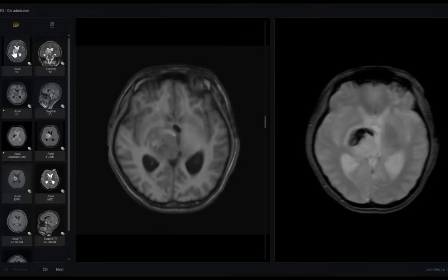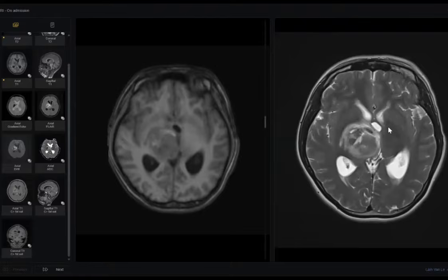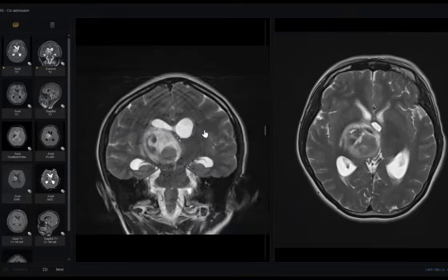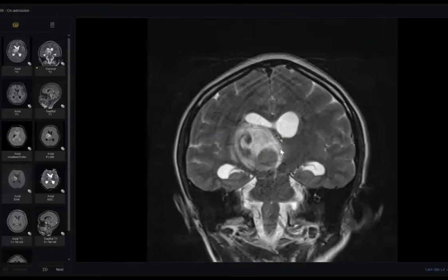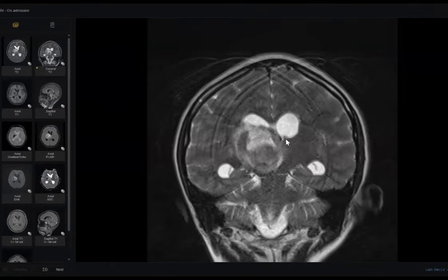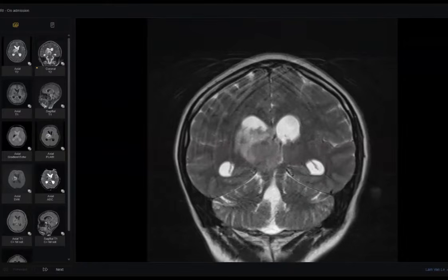Look here. Does it completely efface the third ventricle? Especially here, see the convex border. So this is a mass. Do you agree with me? Look here. Where is the hemorrhage? This is the hemorrhage, the black one, and this is edema. Look beside it. What is this? A rounded space-occupying lesion.